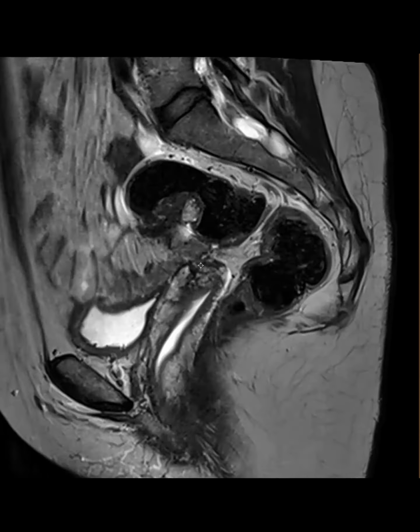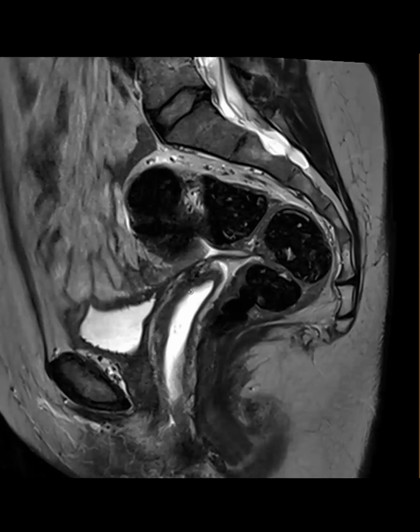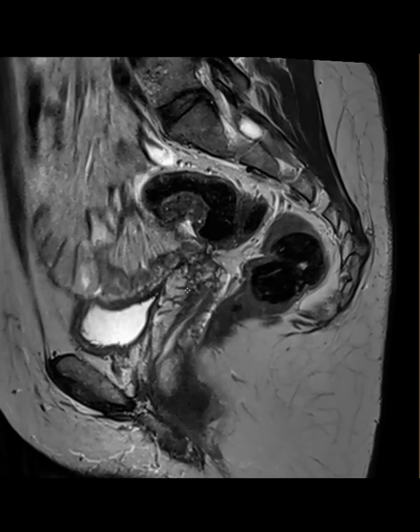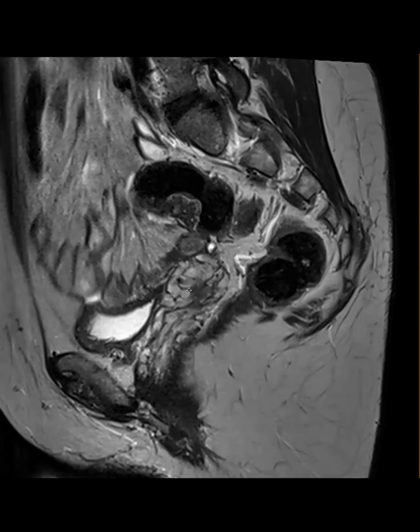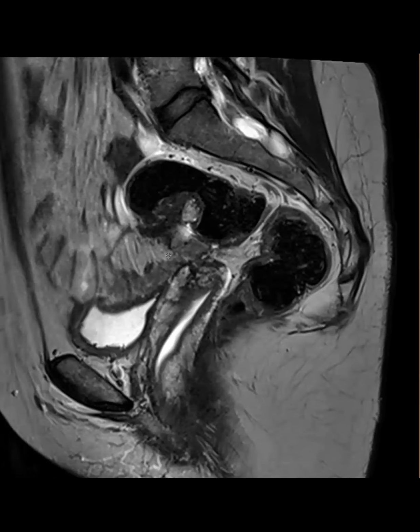I didn't appreciate the tethering to the vaginal apex. Here's the vaginal apex, or even a small bowel loop, right there. Those things aren't all tethered together. Right there. Here, yeah. I think the small bowel is fine, and that's the one area that we're still kind of calibrating. The rectum, we do really well, but the small bowel, we're still figuring out.